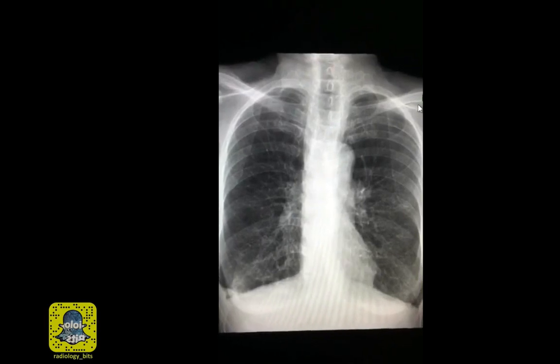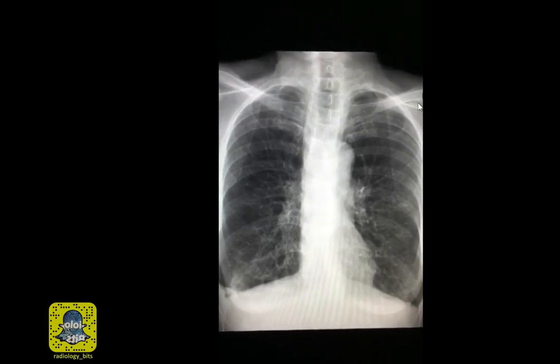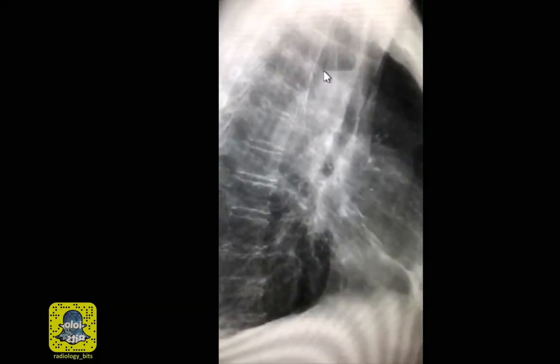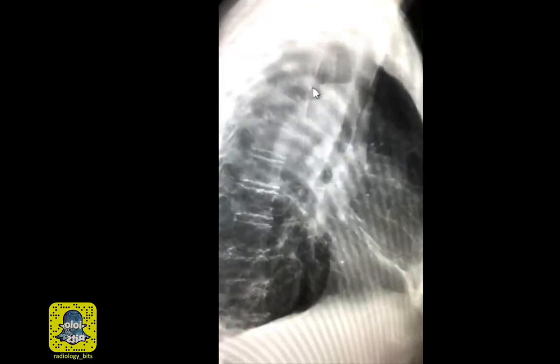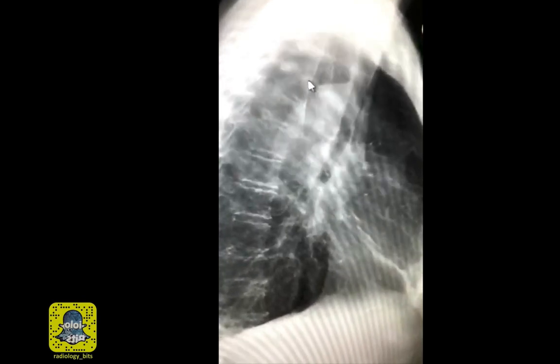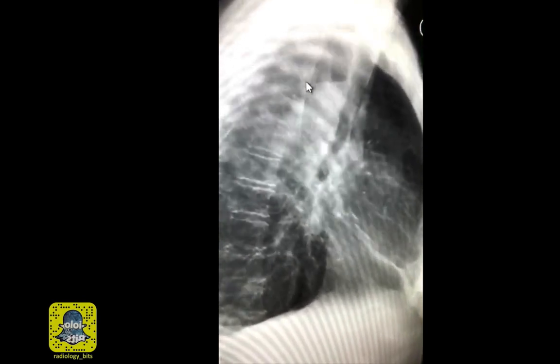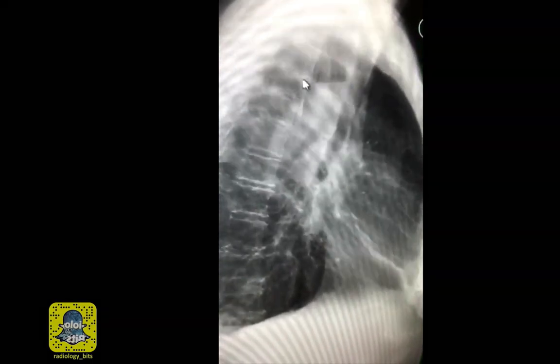A question for more senior followers. Have you seen this on the frontal radiograph? It's there, but it's a tough pickup. On the lateral x-ray, the fluid level resides immediately above the superior border of the aortic arch. It also projects over the same level of this vertebral body, in particular the superior end plate of this body.